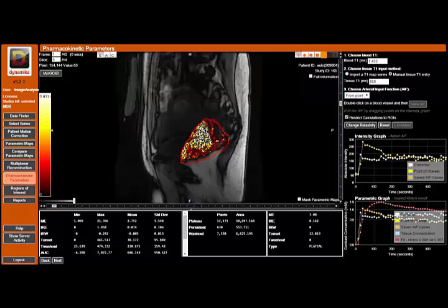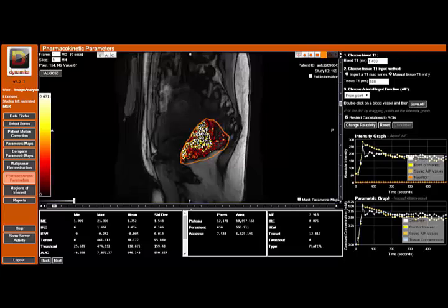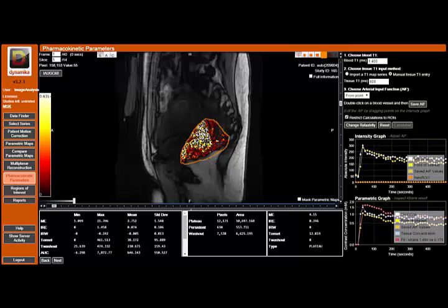If we come back over here, we can see the signal intensity at where the crosshair is, and as we move around here, where we've had a calculation, in the lower graph, and it's a little hard to see, the slightly red thing is the fit we've made to the signal intensity curve, and you can see the other ones. We've got the saved AIF value and the probed value. So all of these let us see how good the calculation has been. Unlike the parametric calculations, where there isn't so much of a quality of fit.